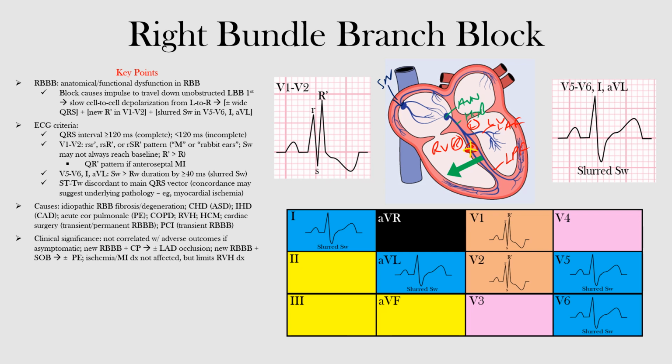Remember that premature ventricular contractions, or PVCs, also result in wide, bizarre QRS complexes. The difference here is that the premature ventricular contraction is aberrantly conducted from its inception, from the start of it, okay? While the bundle branch block is normally conducted until it hits that block. And it is the initial component that gives bundle branch blocks two main appearances with minor variations, the right bundle branch block and the left bundle branch block patterns, okay? Here we're going to focus on that right bundle branch block pattern, okay?